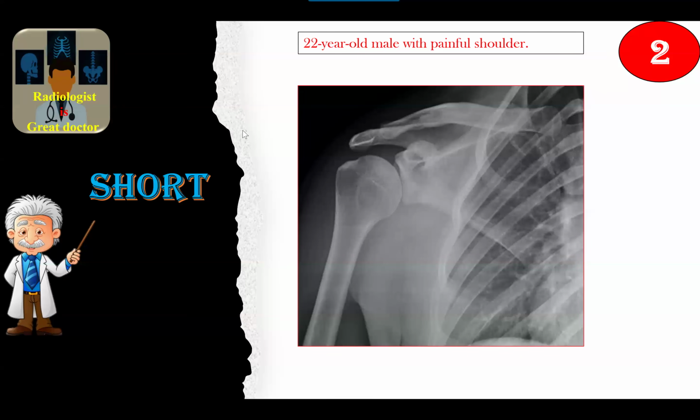I would look at other views, and then I would refer the patient to an orthopedic surgeon for discussion, and MRI if clinically needed. MRI is needed now to look for Bankart lesion. Bony Bankart lesion is not seen. To look for ligamentous Bankart injury, and to assess the internal integrity of the shoulder joint. Again, very good.